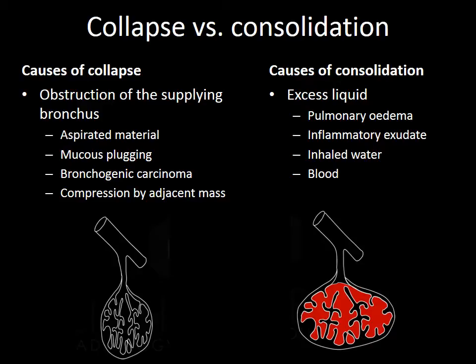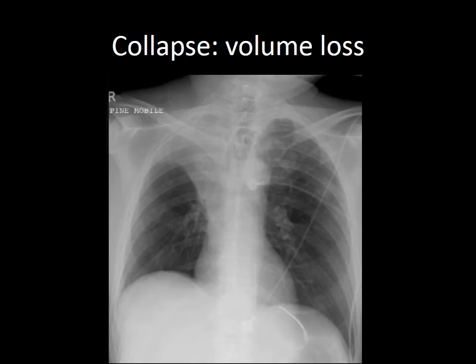Consolidation involves fluid filling the air spaces. This is caused by excess liquid. This may be caused by pulmonary edema, inflammatory exudate, inhaled water, or blood. Consolidation must be present on a chest X-ray to diagnose pneumonia. I will first explain collapse.